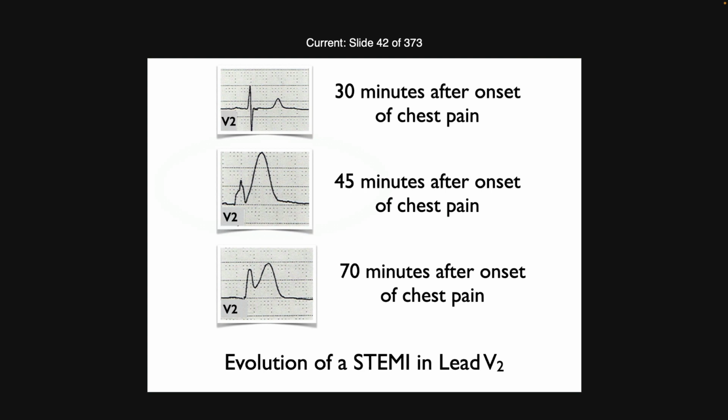I'm going to be showing you today, and next class, probably every class from now on, at least one, probably many more progressions of 12 leads. What I'm going to show you is here's the first one, here's the second. Sometimes it's 3 hours between them, sometimes it's 5 minutes, and the difference.